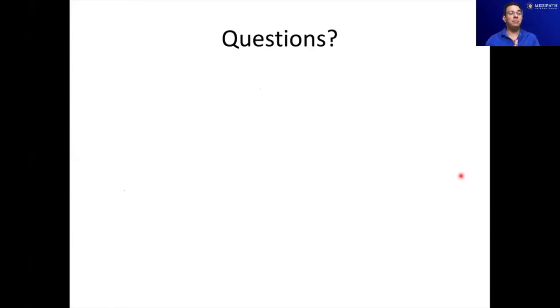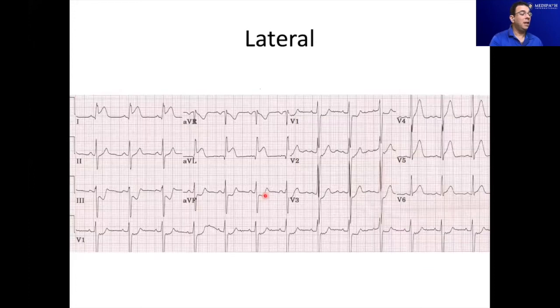So with pericarditis, you're looking for ST elevations being diffuse, but the classic finding in pericarditis is PR depression. Let me flip back to a normal EKG. Classically, you'll see PR depression with the ST elevation, and the ST elevation is diffuse. The only place you should see ST depression in pericarditis is AVR. Every other lead should be either isoelectric or neutral or ST elevated. And invariably, in most of the leads you'll see ST elevation. But the hallmark is the PR is oftentimes depressed.